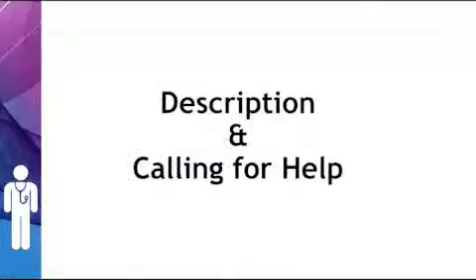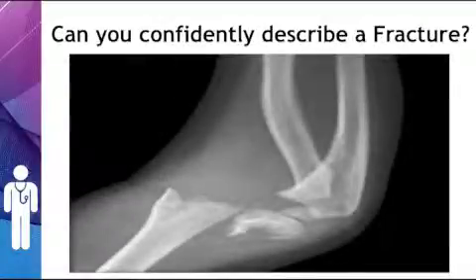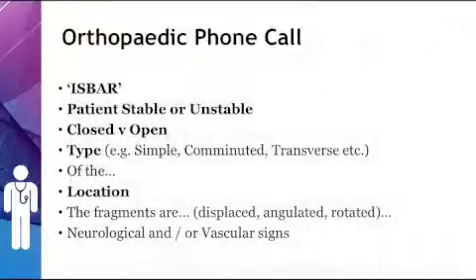So, how do you describe a fracture and how do you call for help? Can you confidently describe a fracture? Our suggestion is to use ISBAR and a systematic way of going through fractures as follows.